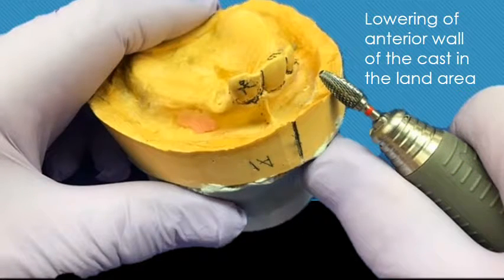It must be noted that we must always maintain the midline in order that we can proceed for our accurate setup. The midline is either grooved in or drawn on the outside of the cast, but it is essential that that midline is constantly preserved. It is not always in line with the labial frenum. The midline is taken from the patient himself or herself in the chair and recorded accordingly as we see it.